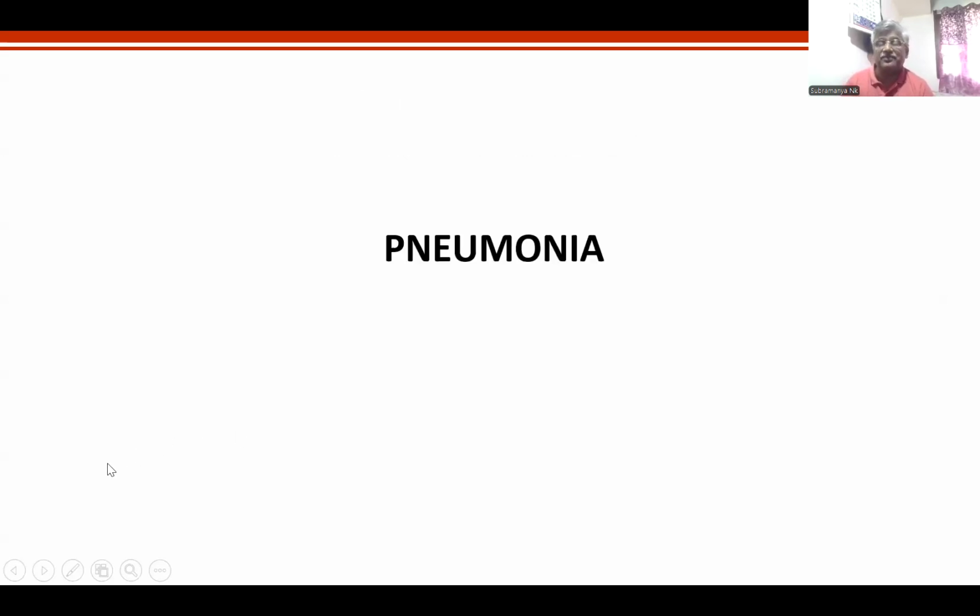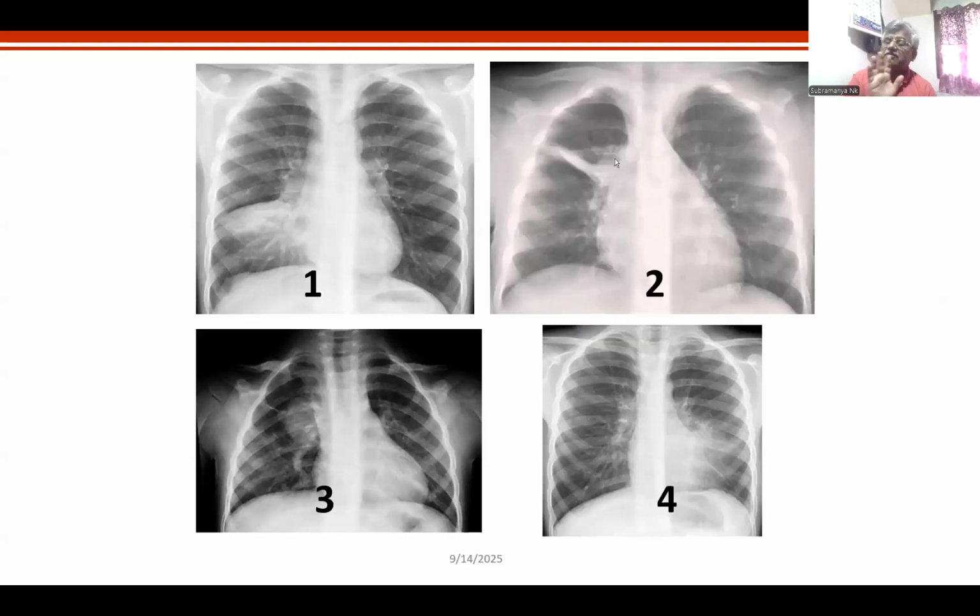This is a suspense. Now I'll go to pneumonia. Pneumonia, I will not show you pneumonia X-rays. All of you know pneumonia now, because pneumonia has to be differentiated from fluid, which I have shown you. Pneumonia has to be differentiated from thymus, I have shown you. Pneumonia has to be distinct from viral lower respiratory diseases, which I have shown. Pneumonia can be round, it can be conical, it can be segmental, lobar, sublobar, multilobar, broncho, alveolar, plate-like, peripheral, central, perihilar, parahilar, upper lobe, upper zone, lower zone, middle zone, pneumonia. In one breath, I told you all the types of X-rays.